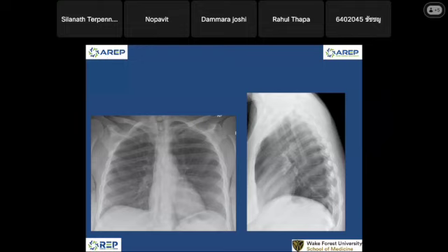I'm going to suggest doing a CT. If this person has infectious symptoms at the beginning, I will say likely pneumonia. Treat the patient, come back and repeat the chest radiograph. But if the patient is old, I'm going to ask for CT. See, the decision making is different depending on the clinical context.